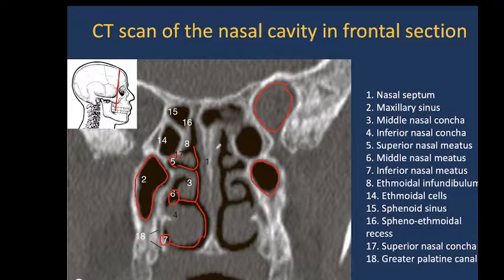Usually doctors use such images, such examination, to diagnose the correct position of the nasal septum, as well as to see the inflammation inside of the sinus, or sometimes they try to find some tumors inside of the nasal cavity, but that is mostly a pathological process.